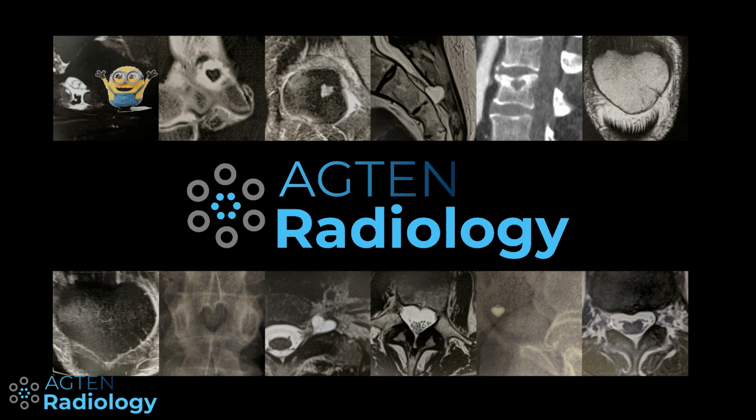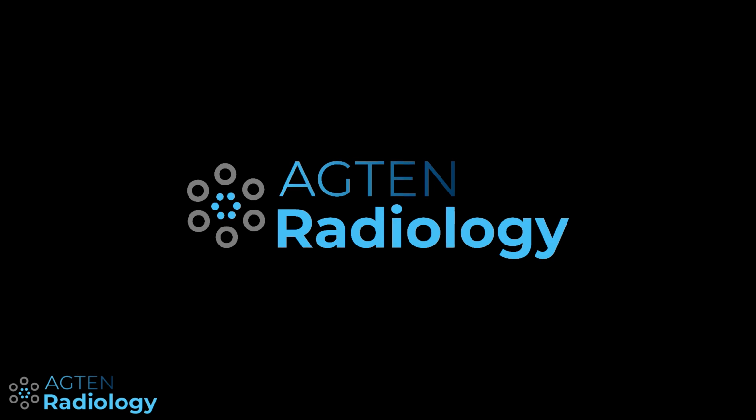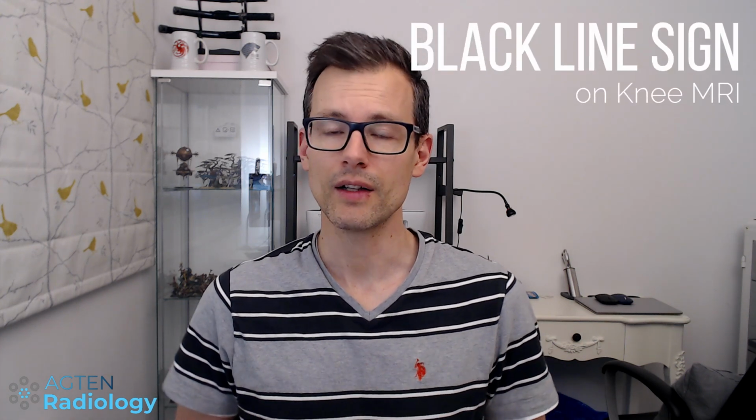If you think that this is a normal cartilage, you should probably watch the whole video. So in today's video I'll talk about the black cartilage line sign, or the black line sign, a specific finding on a knee MRI that you can see. We go through the theory, I will show you some cases, and we have a little discussion about it.